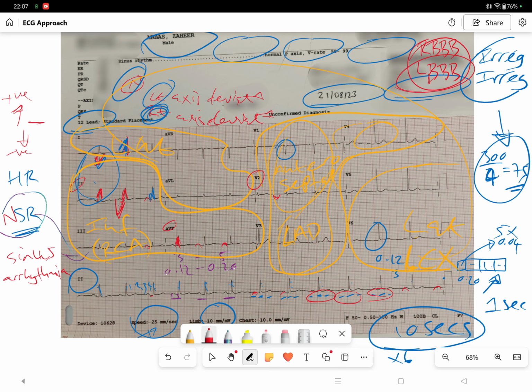Now remember, from the previous video, negative deflection or flattening of the T wave indicates myocardial ischemia, whether that be transmural or subendocardial. But that only becomes clinically significant if the situation is true also for 2 or more concurrent leads. That then starts to give us room for concern. So that's why I look at the heart in a territorial fashion, to look for these T wave inversions as well as other abnormalities that may be there.